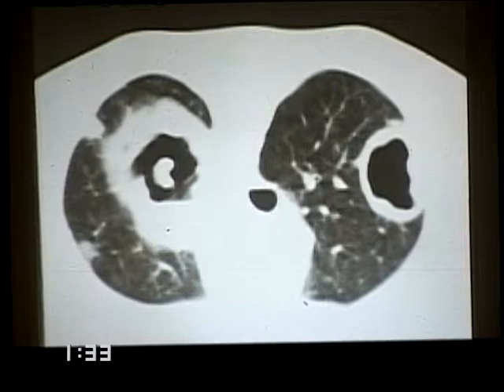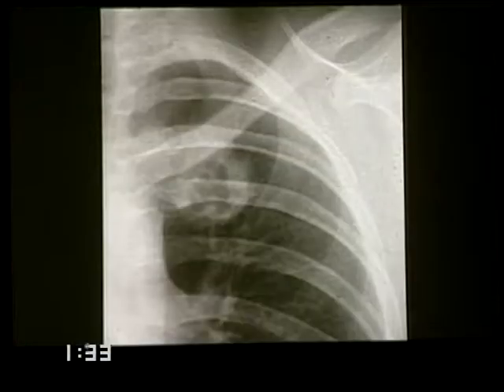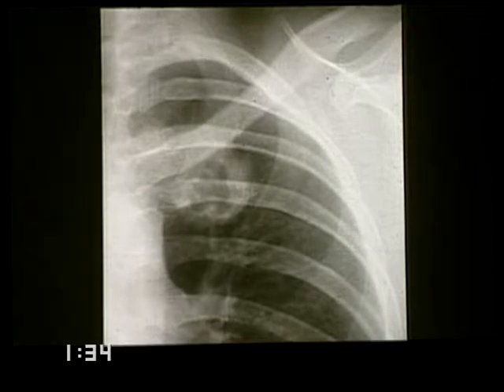Aspergillus in AIDS patients, some believe or have reported that it is rare or uncommon, or even that it doesn't occur. We do see it. This is an Aspergillus cavity in a patient with AIDS with a profoundly low CD4 count.